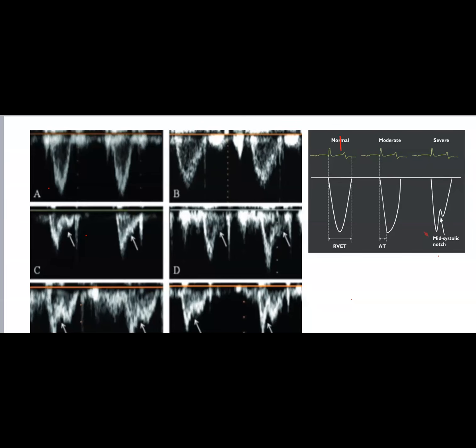So this is important. You remember when we say that when we lose the tricuspid velocity for the calculation of pulmonary artery systolic pressure because of weak signal, because of severe TR or whatever, there are so many other measures we can still fall back on. One of which is this pulmonary arterial Doppler. Now, normally it looks like this. When you start to have pulmonary hypertension, it looks like this. When it becomes severe, it looks like this. So what is the difference between these?